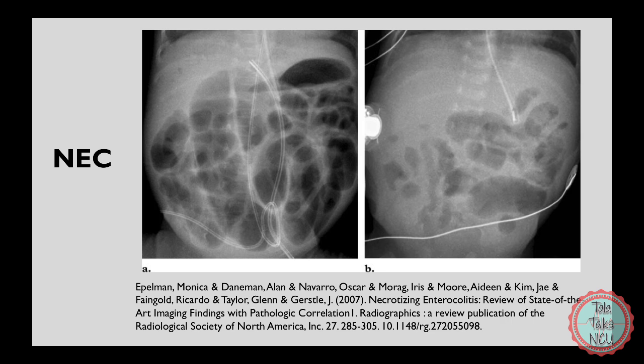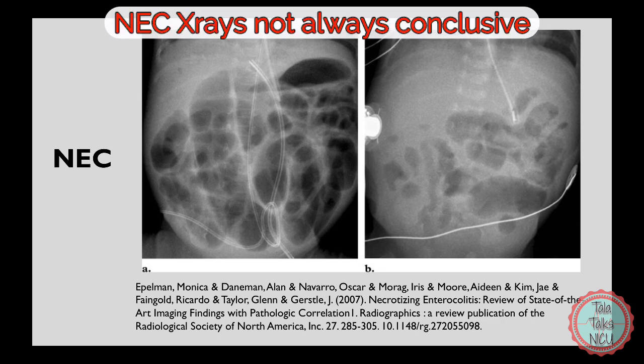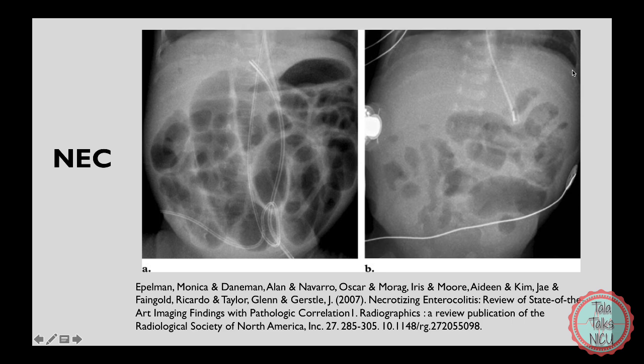This really confuses people, all of us, because the X-rays can look like something else is going on, or that the belly is just filled with stool. So it's important, obviously, to correlate all X-rays with a clinical picture. So here, these two infants do actually have NEC, and you can tell just by looking at the X-rays that they don't look normal. They look very different from the normal bowel gas pattern we looked at earlier.